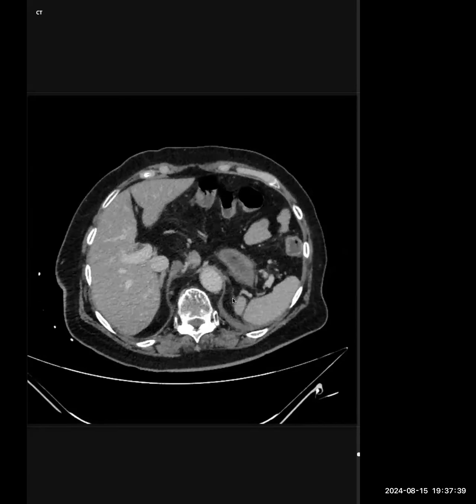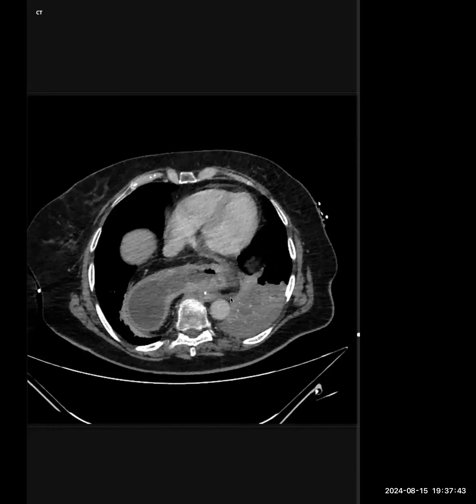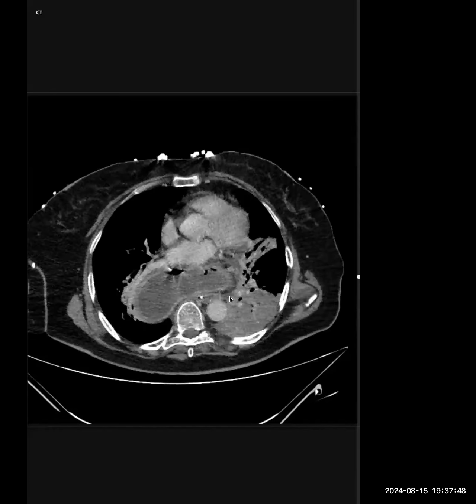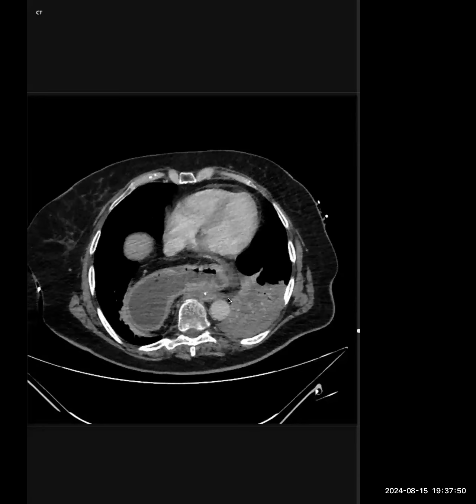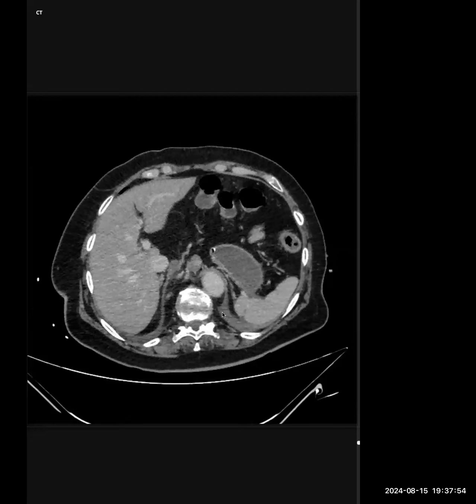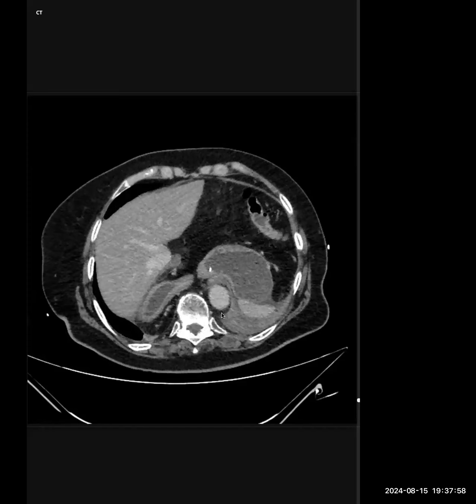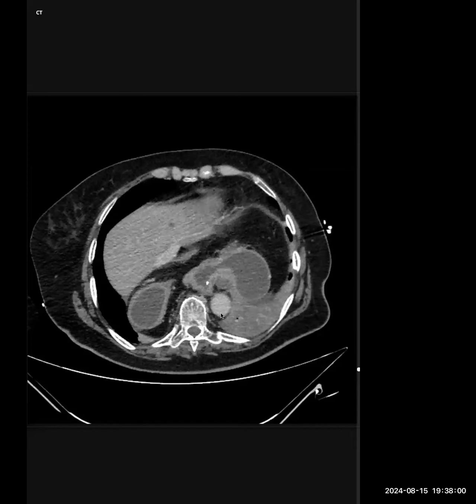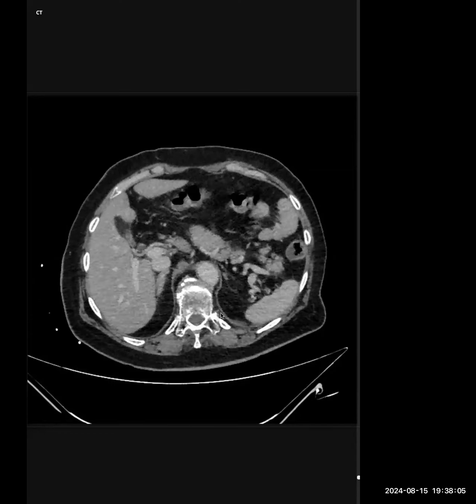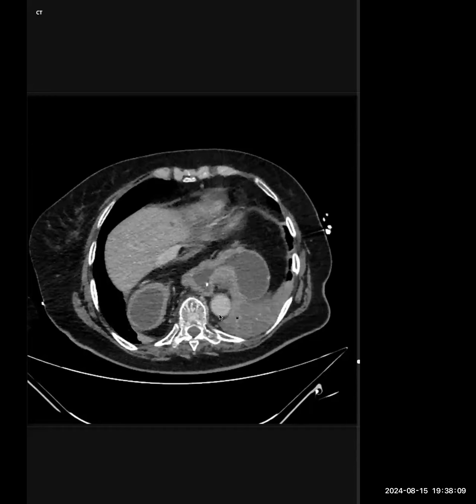The wall appears thick, the thick end of the esophagus, and there is... okay. I think the stomach has herniated into the thorax. I'm not able to make out whether this is... I suspect this is a gastric volvulus with intrathoracic herniation of the stomach.